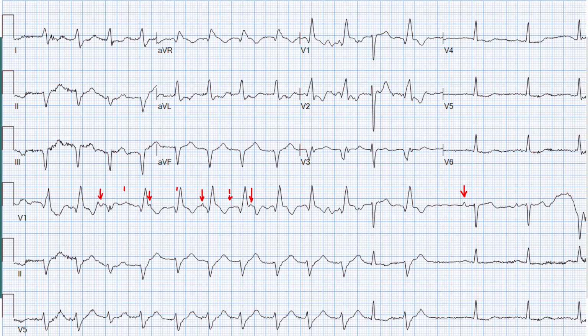We have here a termination of the tachycardia, and we see this is the last beat of the tachycardia that's wide, and then we have a narrow beat here at the termination. As you can see, there is a high-frequency deflection right here, just before the narrow beat, that is a P wave. In this case, this P wave likely conducted to the ventricles and created a normal sinus QRS. Some people would call this a capture beat.